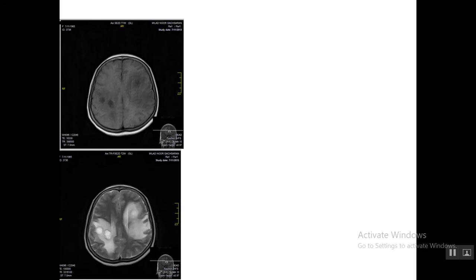Abnormality is somewhat obvious here, as two nearby low signal intensity points, and also blurring of white matter and gray matter here, but not obvious. On T2 MR images, extensive edema around these two structures, which is disproportionate, is detected.